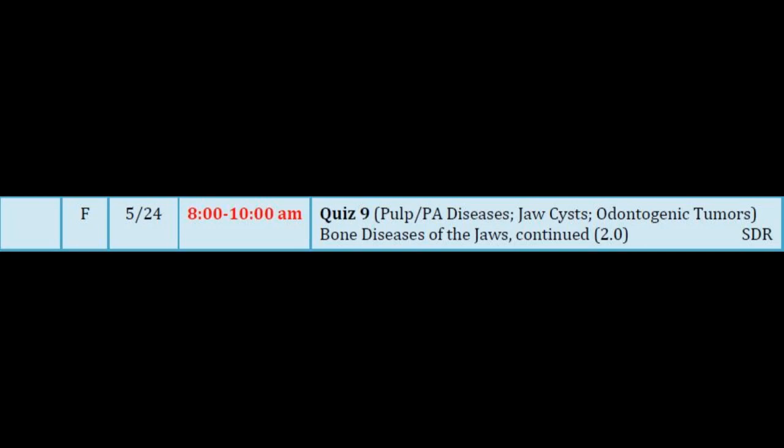Does this look like normal trabeculae? No. But it just doesn't look that bad. And so these can be deceptively innocuous, and it's a deadly, deadly disease. So having a suspicion and getting a patient in for proper diagnosis and getting a biopsy is really important, even though they say, oh, I don't want a bone biopsy. It's like, yeah, they got to have it.